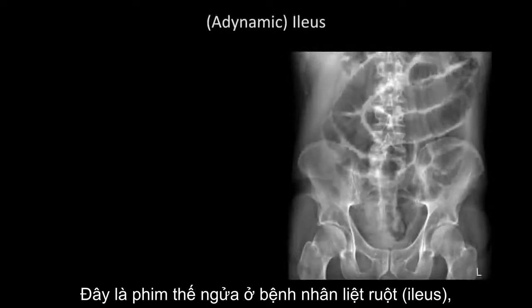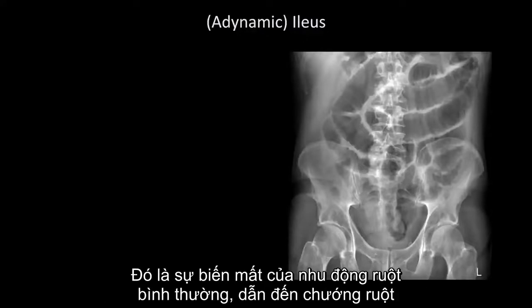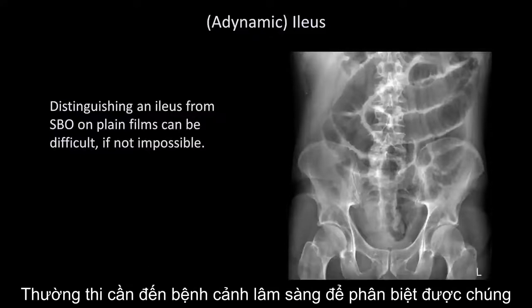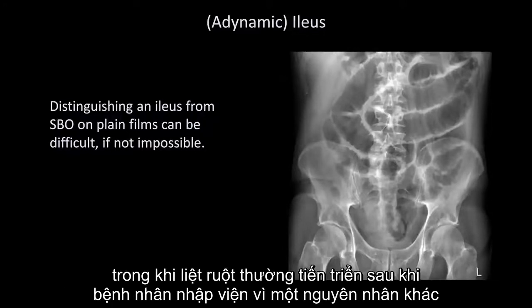Here's a supine film in a patient with something called an ileus, which in common usage is used synonymously with adynamic ileus, in which there is an absence of normal peristalsis leading to bowel distension. Distinguishing an ileus from a mechanical SBO on plain films can be difficult, if not impossible. Often the clinical context may be necessary to distinguish them, in that a mechanical SBO is usually the reason a patient presents to the hospital, whereas for an ileus, that's usually something that develops after the patient has already been admitted for something else.